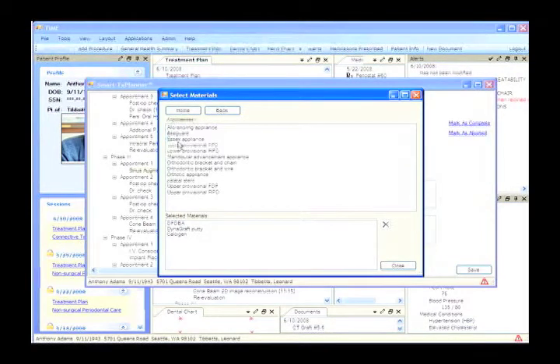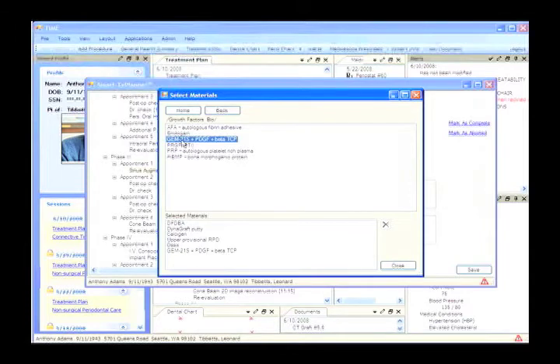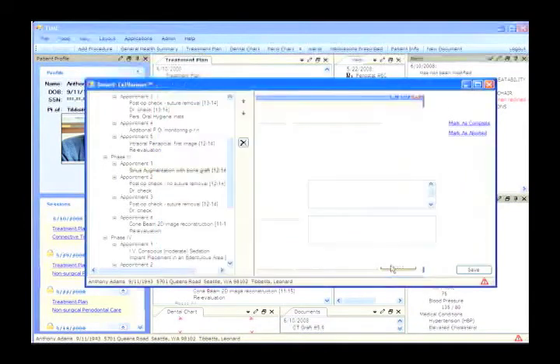I want to make certain there's an appliance ready for me at that time too, that it's been received from the restorative practice. I'm going to have a barrier membrane in place just in case I elect to use it. Sinus augmentations, I always like to use certain growth enhancement factors. I'm going to use some of this material, or I want it to be available. But then again, I might also want to use this in its place. So I can build a materials list.